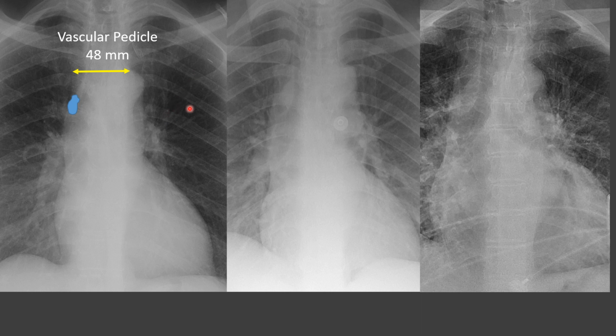And then lastly, we want to look at the vasculature. So here's the vasculature out here. So the vessels in the upper lung zones are somewhat small in size. And this can be kind of hard, again, for trainees when they first start out. What I typically do is look at the vessels in the upper lung zones, and look in the lower lung zones. They look smaller than the vessels in the lower lung zones. If they do, I'm okay with it. And so you can see that the vessels in the upper lung zones look fairly small in size.